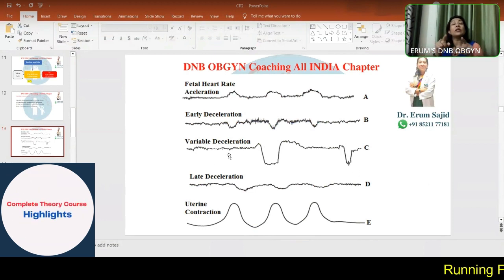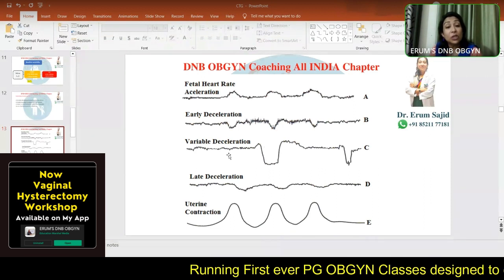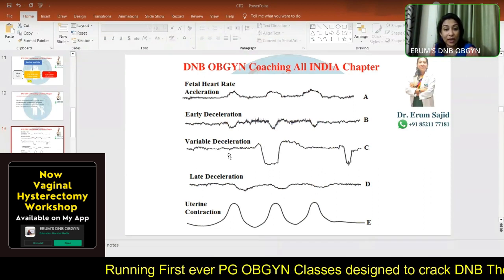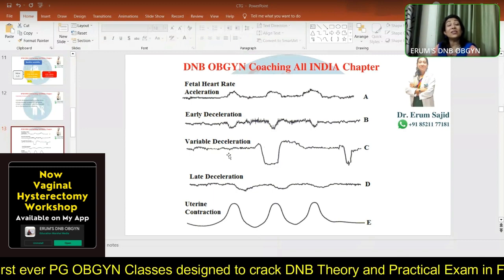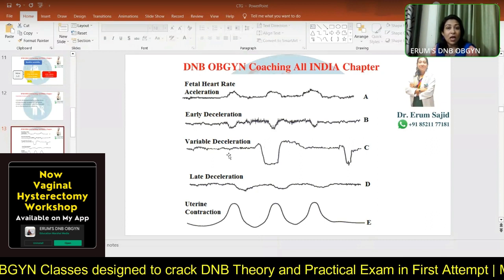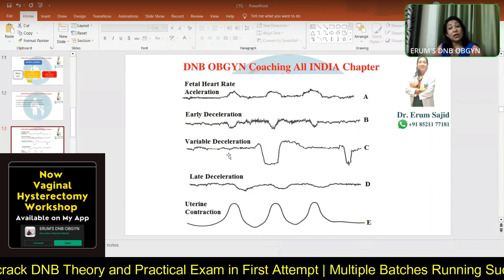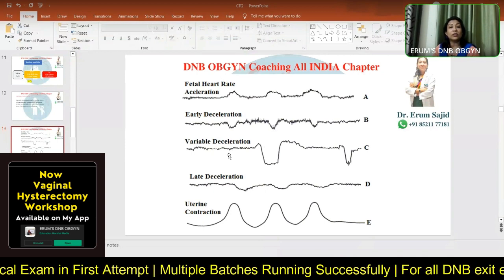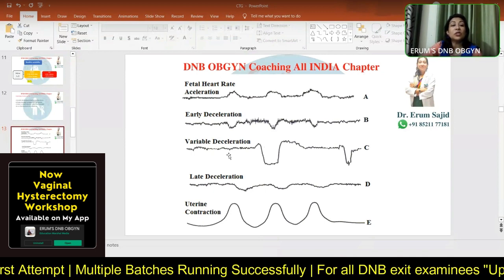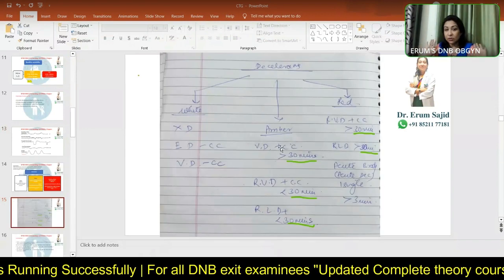They are the decelerations on which you can sit. But you sat for 30 minutes, even despite the fact that they were showing concerning characteristics, as you can see over here as well. The beat to beat variability is almost gone in this case, and you're still sitting over it because they're not happening repeatedly. You getting me? It's coming once in maybe 3 minutes. The other one came a little early. Then the next one's coming after 10 minutes. So you were sitting patiently, observing that they're not repeated, because of which you are not so much bothered. But if it crosses the 30 minute mark, that is when you alert the superiors.